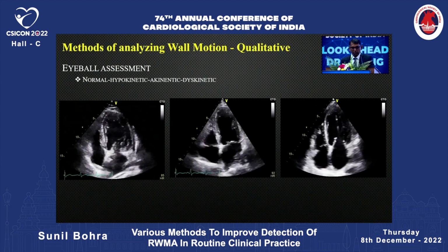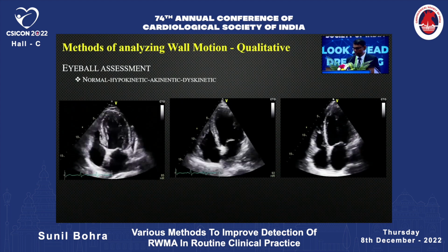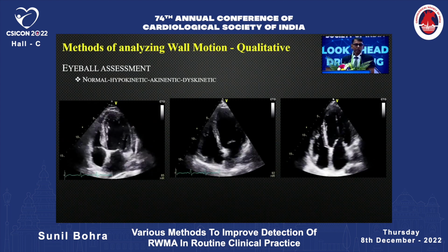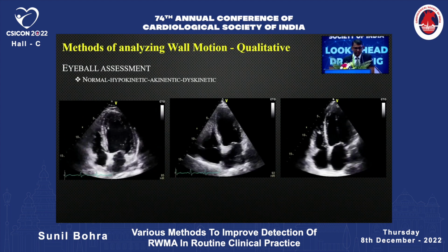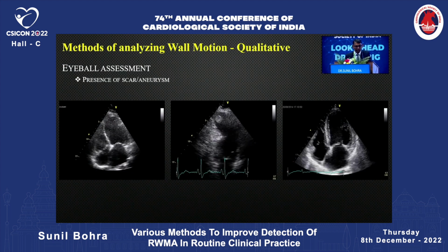But here the word of caution is, for a novice it's very difficult. If I show the right side image to a person who is not doing routine echo or has just started to do, he may give it as normal. So the eyeball assessment has to be done very carefully, and it comes with experience, and it's not to be followed by a novice. And also we look at presence of scar or aneurysm.